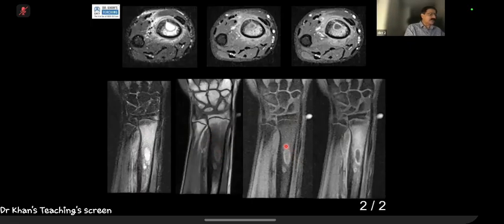Now, this sign is known as penumbra sign, and this is an exam sign. Develop your eyes on this. On a T1 weighted sequence, an abscess will have high signal on T1 weighted sequence. You know, the periphery will have a high signal. Penumbra sign is an exam sign. When you give contrast, it enhances.